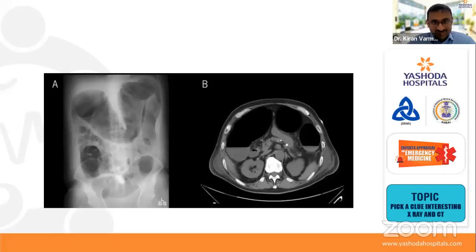Okay, no problem, sorry for the typo. Don't worry, Usha, you are on track only. You're right. See, you can see the distension of the colon. So obviously there will be no obstruction at all. There will be a dilatation of the colon. So this is toxic megacolon.